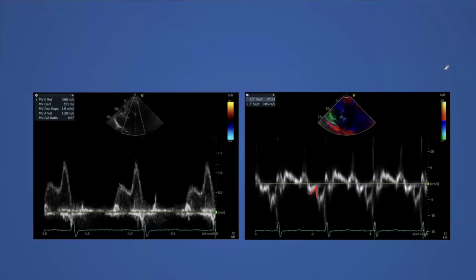I mean, tissue Doppler is still Doppler. It's still the same principles of spectral broadening and so on, regardless of whether it's annular velocities or actually blood velocities, which is the difference between the E/A and the tissue Doppler E prime there. So if you get that fuzzy one, you know, I know we asked for 110 images, so I get it. But it is a common source of problems, and this has been part of the problem with diastolic function, and it is technically quite demanding to get everything.